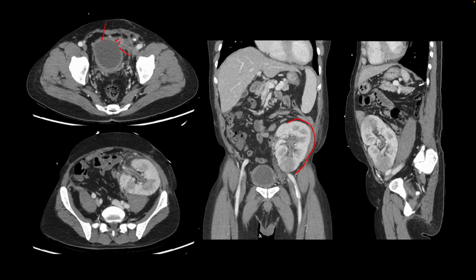And so they have cystitis, and usually it's an ascending infection, and then it can go through the anastomosis site to involve the kidney. So we find that there is mural thickening and enhancement of the ureter and the collecting system, and we also find that there is patchy hypoenhancement of the inferior pole of the transplanted kidney, suggesting acute pyelonephritis. So this patient has cystitis and acute pyelonephritis involving the transplanted kidney as seen on the CT.